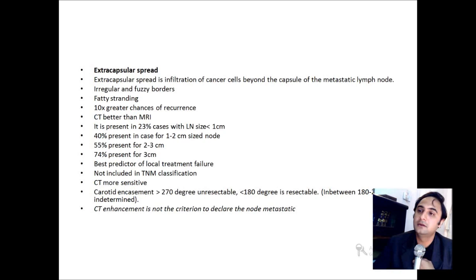And the fatty hilum will also disappear. It is irregular in case of extracapsular spread, with fuzzy borders and fat strandings, and there are almost 10 times more chances of recurrence than in a node without an extracapsular spread.